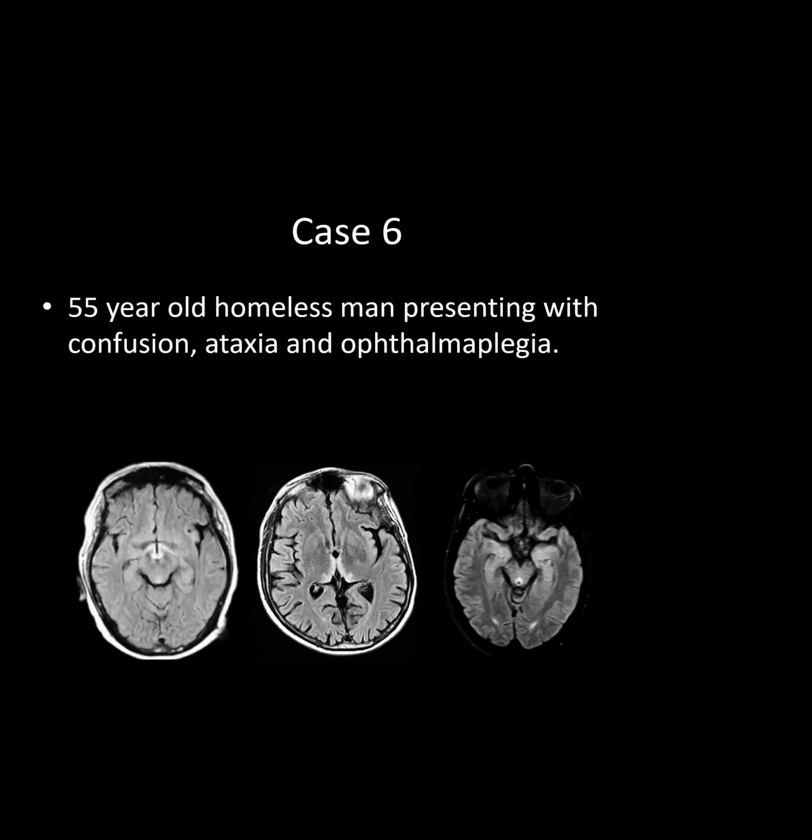Hello? Hey. Hi. Okay, so take a look at this case. There are 2 FLAIR images, and I think this is a diffusion weighted image. Tell me what you see on here. What structures are affected?